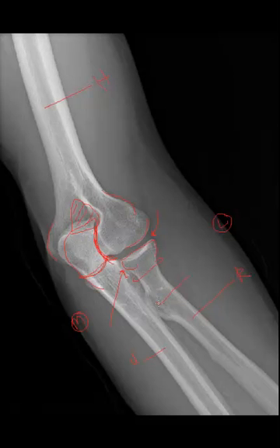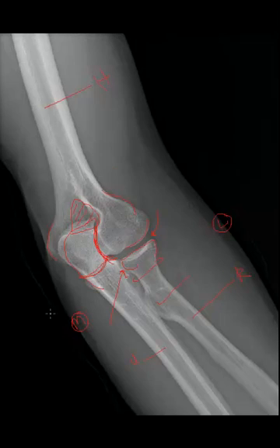It's most commonly in the proximal third or so. But that fusion prevents supination and pronation. So it's very important when you evaluate these radiographs to make sure that the radius and ulna proximally are indeed separate and have distinct cortices between them. In terms of the medial oblique projection, I think we've covered all the anatomic structures we can see well in this location, and let's move on to the lateral projection.